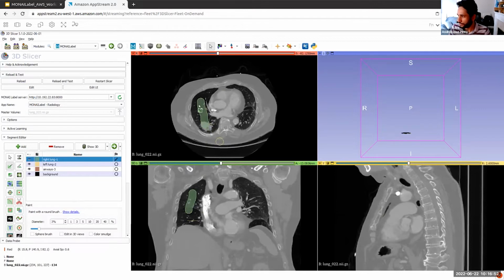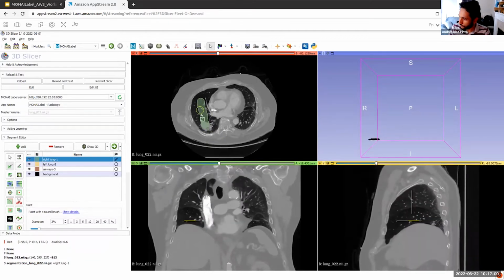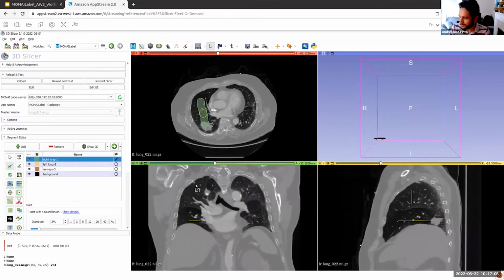And then if you press the Shift key and you keep it, you can move the cursor and you basically move all the views to be in the same position. So I can provide seeds in the same place, right? You can only click or click and move the cursor and provide seeds for that.